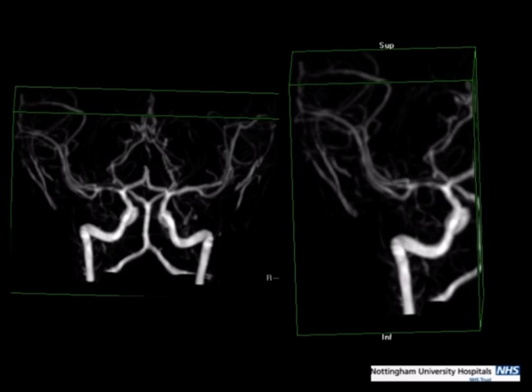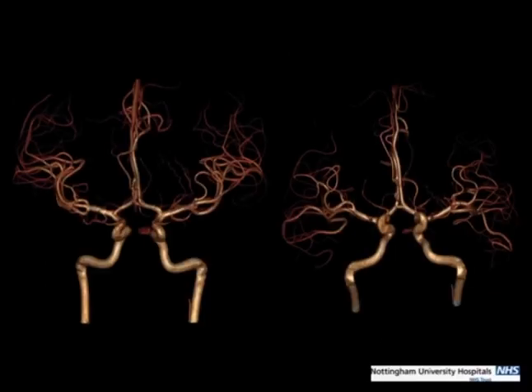potentially. And this was the MR angiogram, and the reason to show you this is that a large proportion of children have arterial abnormalities as a cause for their stroke if it's not cardioembolic. And in this case, you can see that there's abnormal thinning, beading stenosis of the right MCA, which 3 months later on follow-up had completely resolved. So again, here you can just see that it's now nice, smooth and fattened up again.